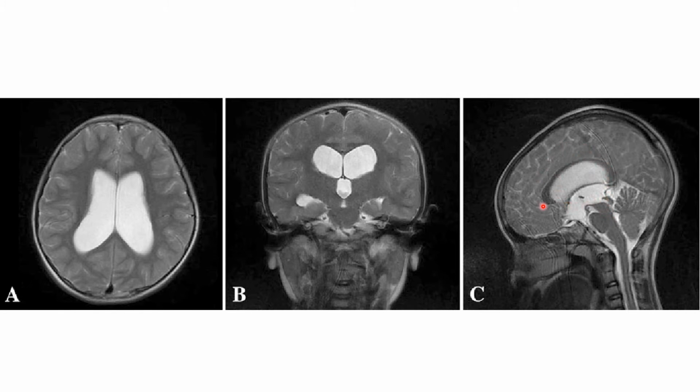So this is an example of obstructive or non-communicating hydrocephalus. If the fourth ventricle was dilated, this is how we diagnose communicating or non-obstructive hydrocephalus due to decreased resorption of CSF in the arachnoid villi.